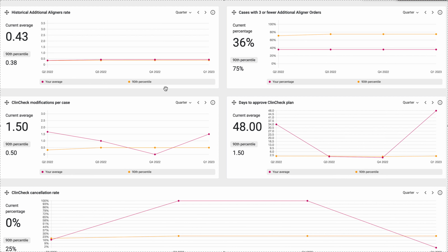The other thing this doctor is not doing, besides not using virtual care regularly, is, what's the other benefit? Oh, we just set up preferences for this doctor. So now that the global personalized preferences, which is a new feature, I just made a video about that today as well. This should really cut a lot of this down.